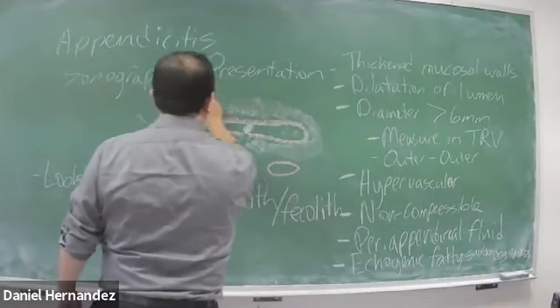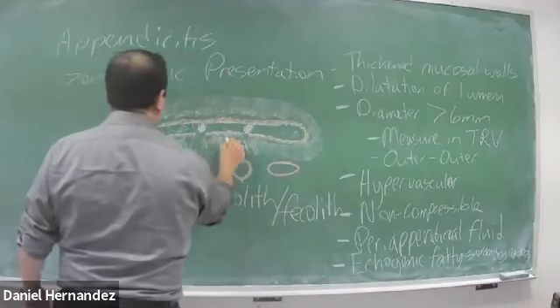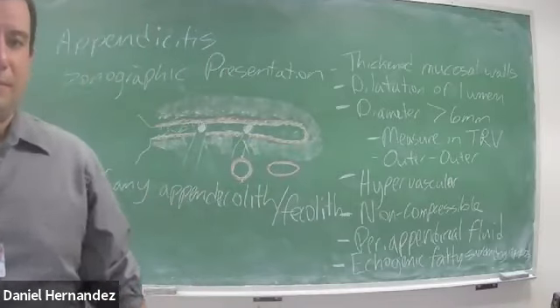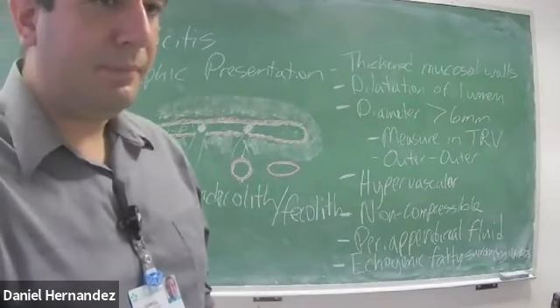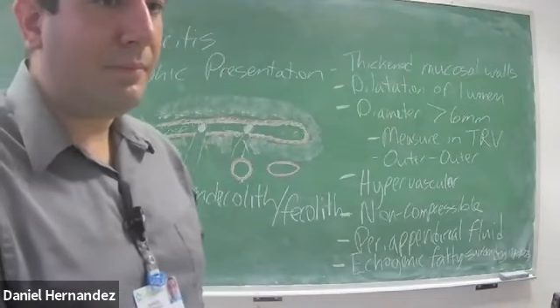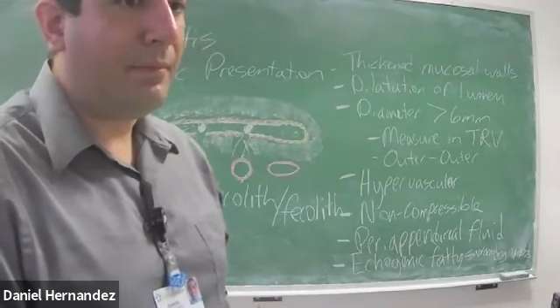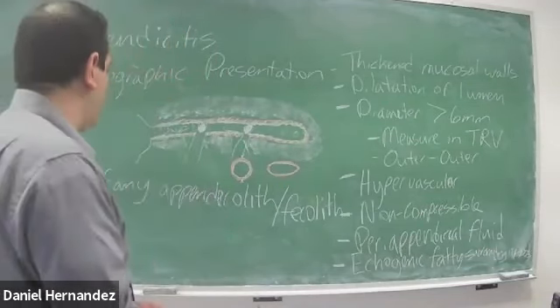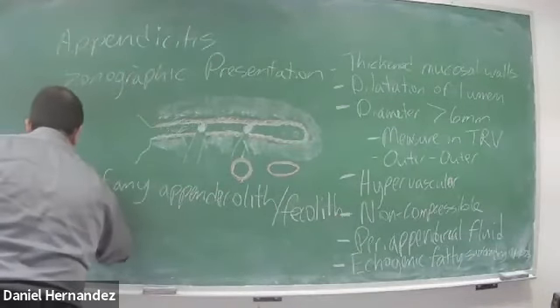Another sign of infection. It's going to look right around that appendix. We can also potentially see enlarged lymph nodes.